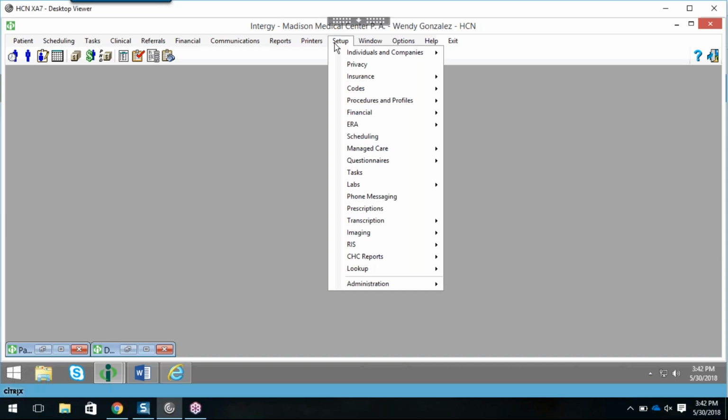If you're looking to revamp your image categories or to create these drop-down lists, because you might not have them currently, you might want to create all your lookup folders first and then come back to the image categories. That way you're not going back and forth.